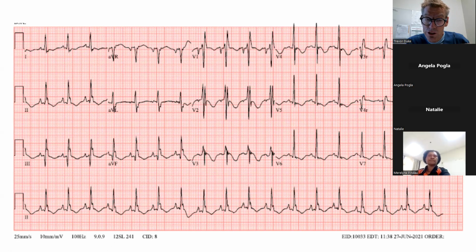Because if you've got a child who's got right atrial hypertrophy and a right bundle branch block, you're starting to think maybe there's something going on with the right side of the heart. Could it be a tetralogy of Fallot, or could it be some other problem, perhaps a cardiomyopathy with thickened right ventricle? There's lots of different things that could be happening, but you can get an idea from the ECG where the pathology is in the heart. You can clearly see it's in the right side, it's involving the atrium and the ventricle, because you've got a right bundle branch block and you've got P pulmonale.